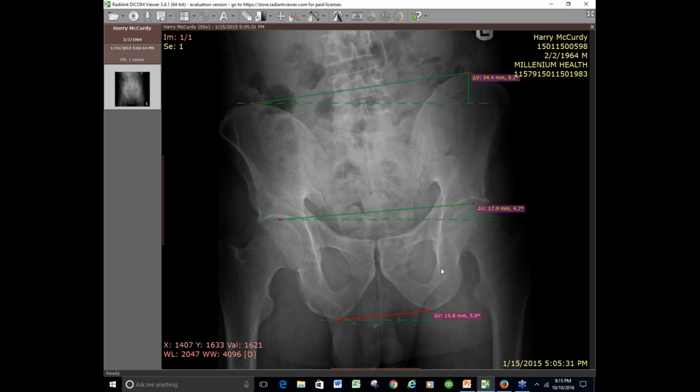because I'm still having trouble with our therapists at the clinic getting this done right, because it's such a big change. So one of the things we were looking at is like, wait, how come we put this guy in a 24 millimeter lift and he measures just extremely high on that side? Well, this distance here is not the same as this distance here. So what that's telling us is if I were to actually extend this line to the same distance as the other line, it actually would give me a much bigger deviation. So it's not the deviation we care about. What we care about is the angle.